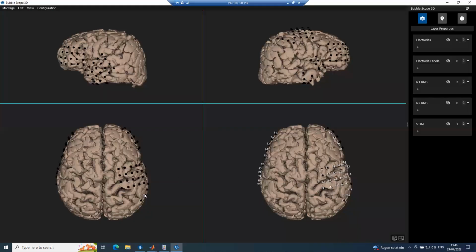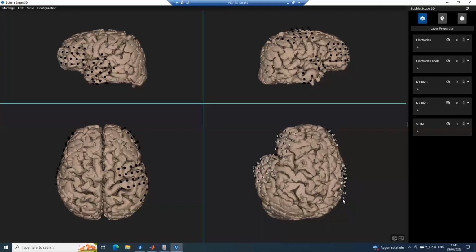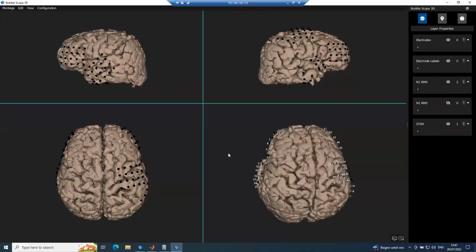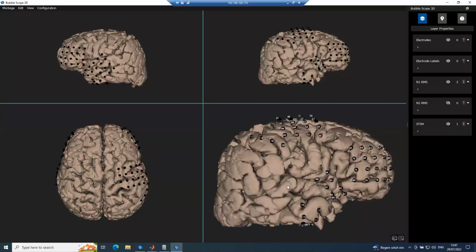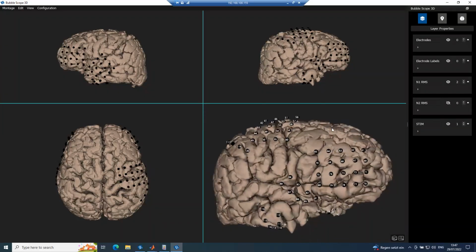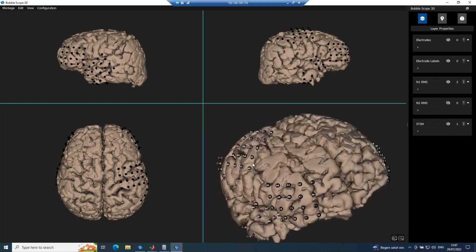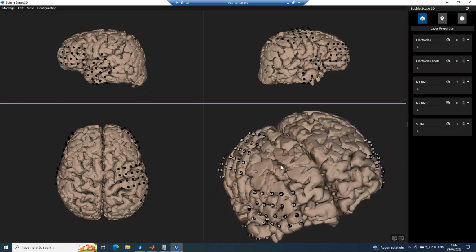So you see that we have our brain inserted here, and this is where the tool of MJ comes in. Basically, we need the brain model. For this demo data, the brain model is already loaded, or already linked to this model.